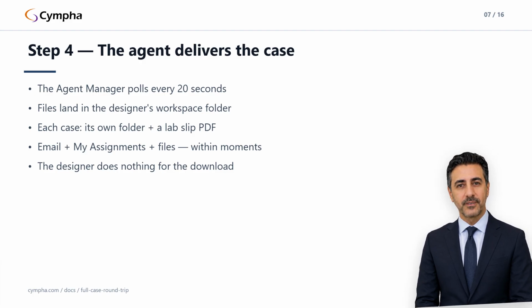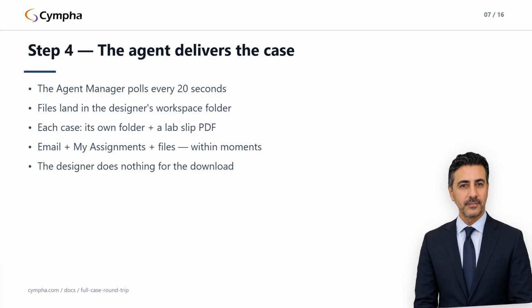From the designer's side, 3 things arrive in roughly this order. First, an email from Cympha telling them about the assignment. Second, the case appears in my assignments on app.cympha.com, with status designing. Third, the case folder fills with files in their workspace. The designer does absolutely nothing to make the download happen, the agent handles it.